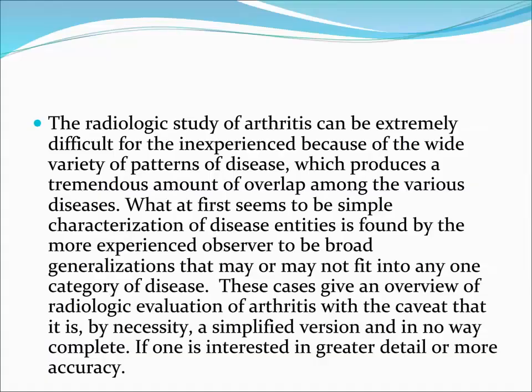Let's start. The radiologic study of arthritis can be extremely difficult for the inexperienced because of the wide variety of patterns of disease, which produces a tremendous amount of overlap among the various diseases. What at first seems to be simple characterization of disease entities is found by the more experienced observer to be broad generalizations that may or may not fit into any one category of disease. These cases give an overview of radiologic evaluation of arthritis with the caveat that it is, by necessity, a simplified version and in no way complete.